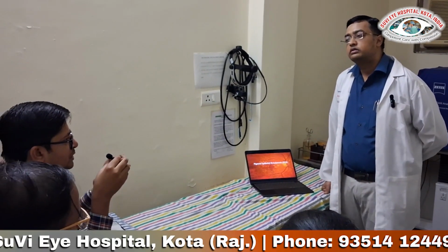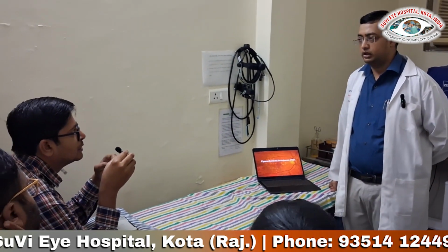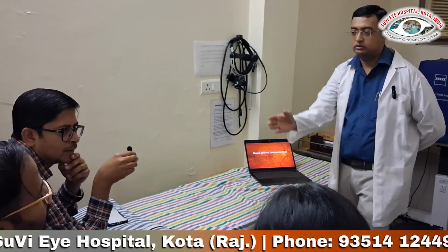There will be a club shape, and neovascularization will be seen at the sub-RPE level. Okay. And thumb-like PED, right?